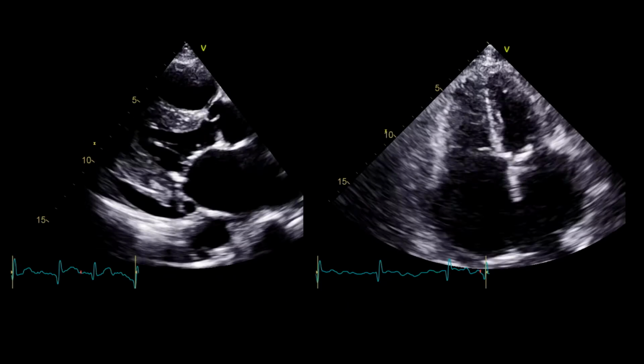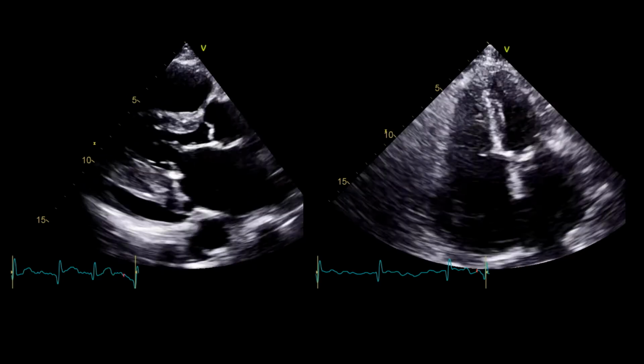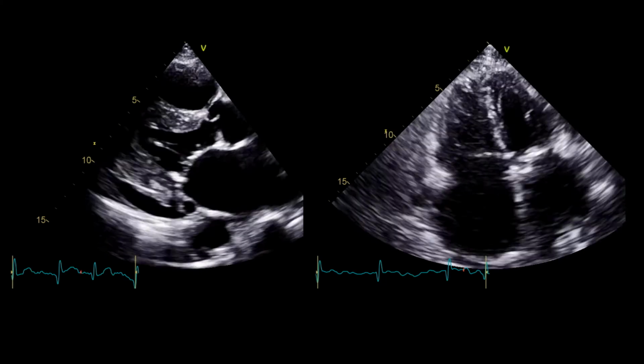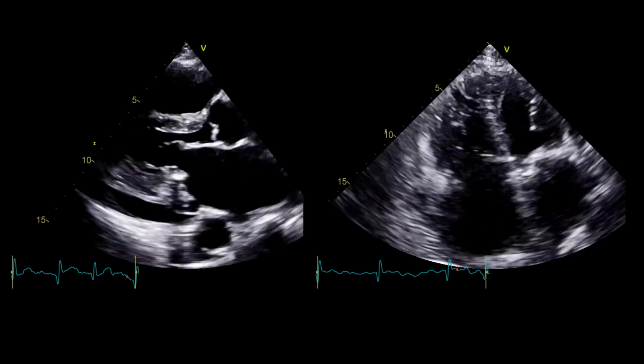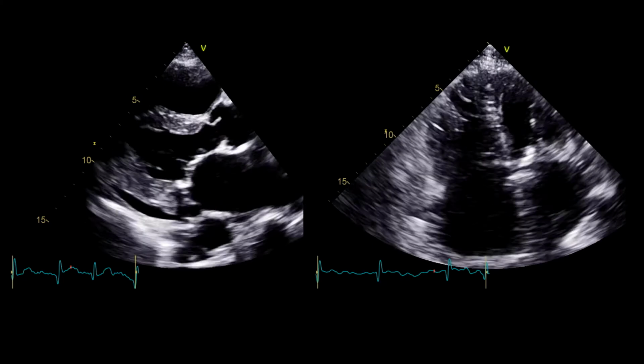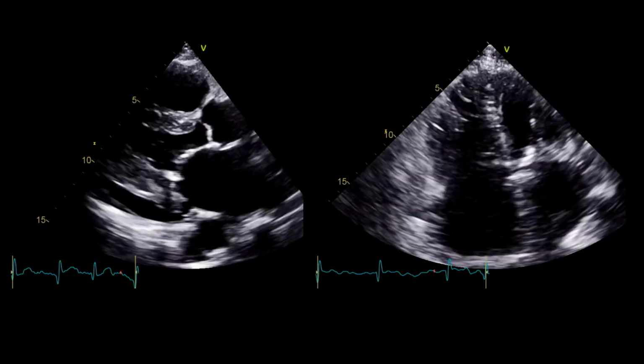I would advise to really focus on the parasternal short axis views for this pathology, as the septum is hard to really get a good feel for in the other views generally used. These views are helpful for other reasons, such as RV morphology to distinguish the cause of the septal changes.